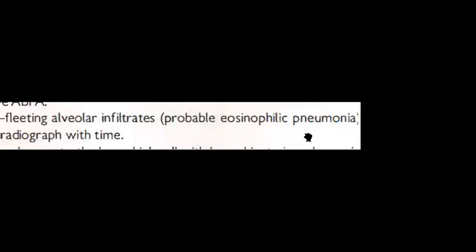Let me show you something. So the most important thing to mention is that, yes, fleeting alveolar infiltration, yes.